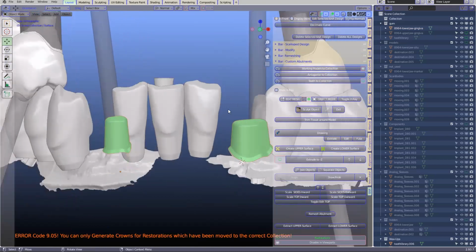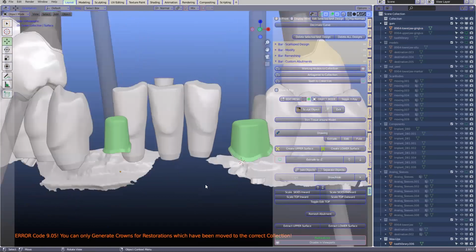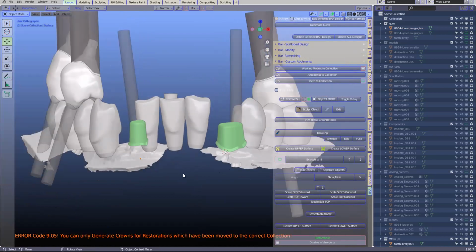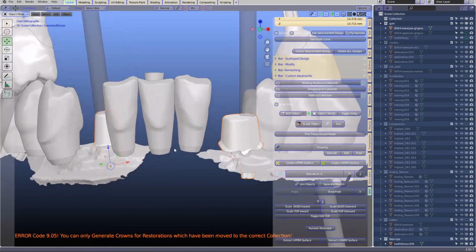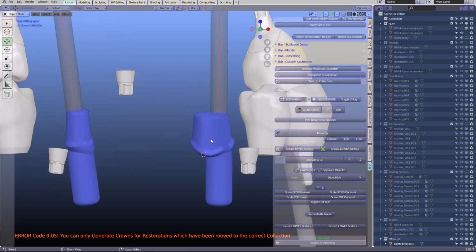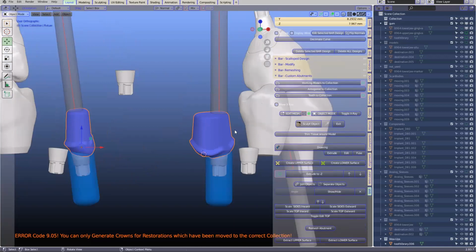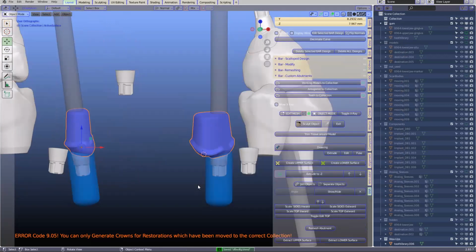Before you extract the surfaces, was it still possible to create the occlusal side, the incisal side? Can you pull it up or down? You know what I mean? Yeah, actually, let's go a few steps back before we actually do this. Just also save your work. Before we do this, file, save as, blah, blah, blah.